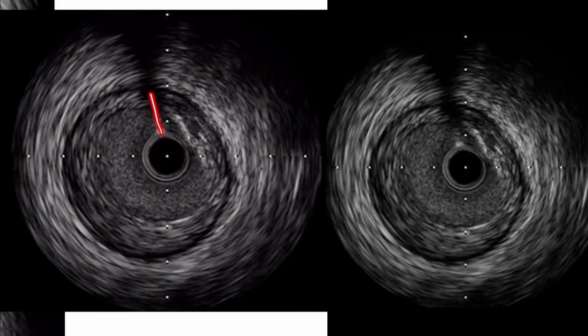Here you actually do have wire artifact. So what you're gonna see is this brighter white close to the catheter because the catheter is over the wire, right? And then you see this shadowing out here that we call wire artifact because the wire is metal, right? And it can't penetrate or see through it. So you're going to have that shadowing where that wire is, which isn't a big deal. If you're measuring a diameter, you don't want to pick the part that the wire's at. Pick a part where you can see the media.